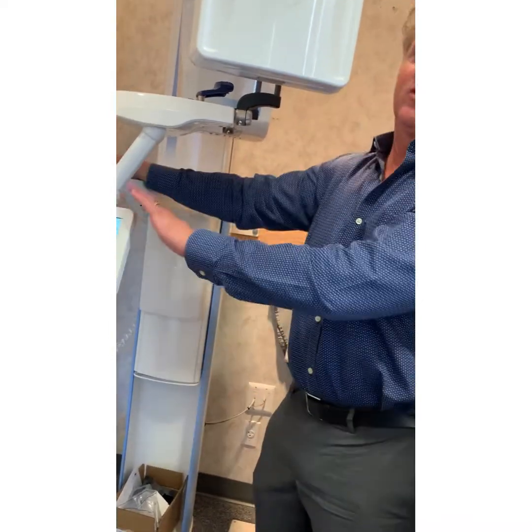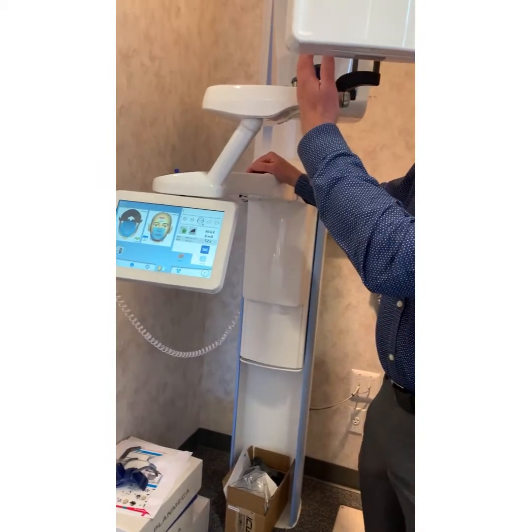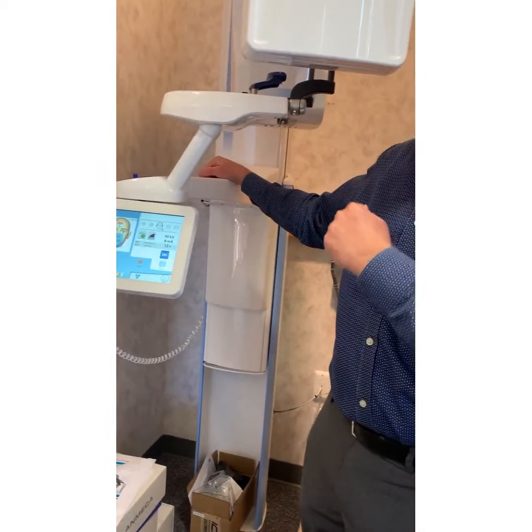Right, there's wires. Everything's good. I'm still concerned about this side. Because this no longer becomes a factor once you know that you're looking at it from a 90-degree angle, a flat profile for the pan. Would you agree with that too?